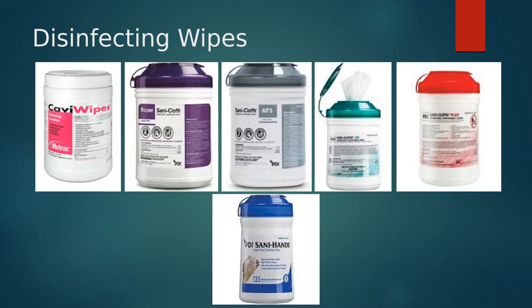So you're going to see a lot of the purple, gray, and green. Again, be cautious with using these wipes on the soft surfaces of the machines. These can be used for the exam table, the plastic chair that you sit on, and the top part of the transducer. We just want to avoid deep cleaning the machine itself and the cord with these. We typically will have another spray that we can use for those surfaces, just because those plastics are a little soft.